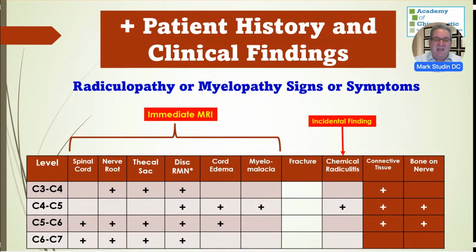That patient might need immediate medical care, might need immediate surgical care. Oh, I don't want to work with a surgeon, my decompression can do everything. That's nonsense. If that spinal cord is compressed, you're spinning the dice if there's no space for that cord to go. And you're spinning the dice, especially if you see signs of cord edema. Myelomalacia is soon thereafter. Cord's going to start to die. And that die is die. It doesn't come back. It'll have to reroute itself, but it won't come back.